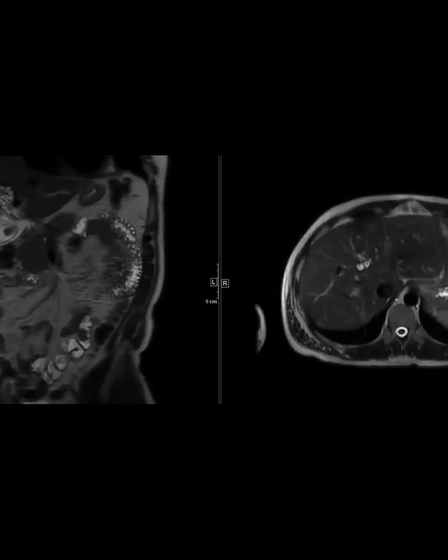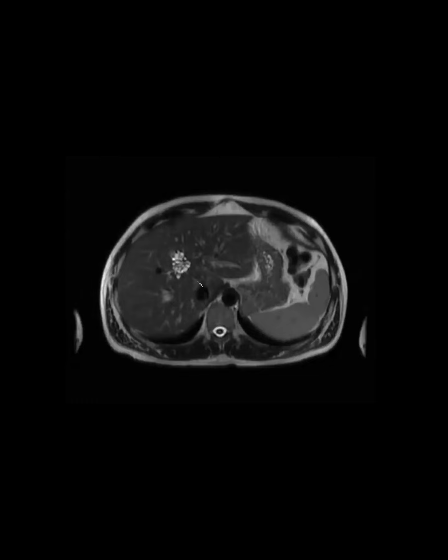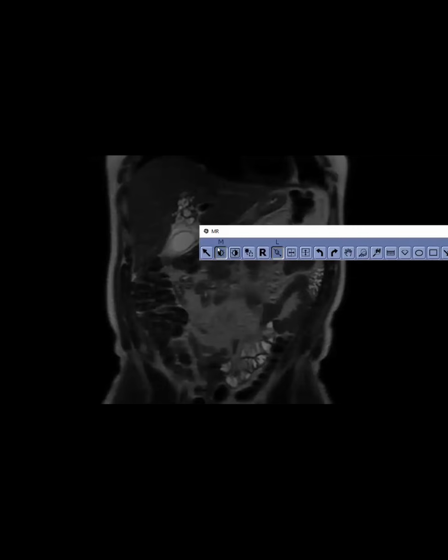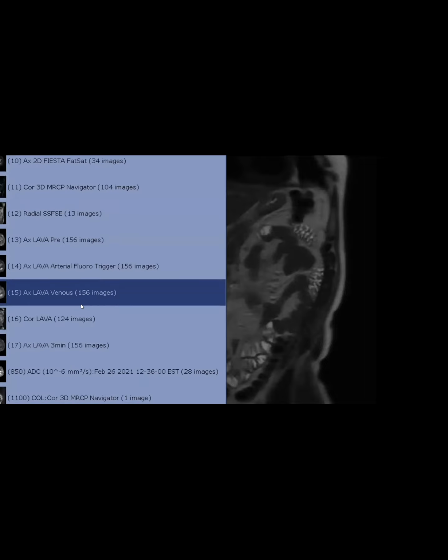Okay, this one is the next one. What do you guys think about this liver lesion? Is there a coronal? It looks tubular. Yeah, we thought it looked almost like a serous adenoma, but in the liver. But I don't know any lesion that's like that. It looked kind of tubular, multicystic. This is the coronal. Something in the IPNB spectrum. Exactly. That's what we were thinking about. We were pretty convinced about that.